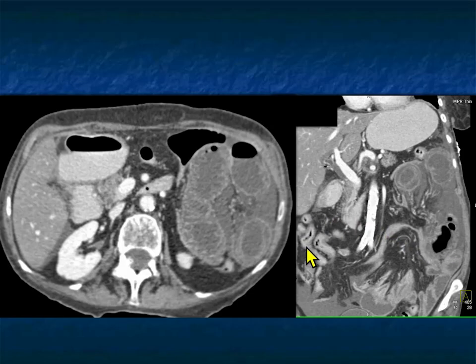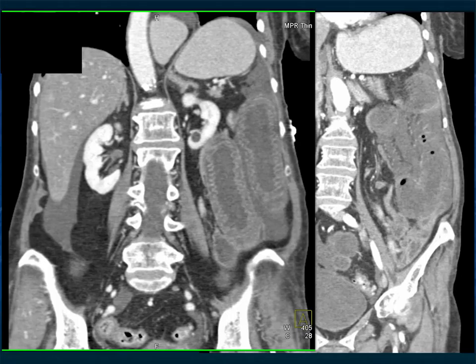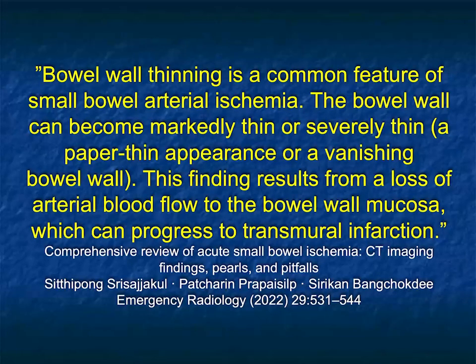Look how nice the distal small bowel loops are. Look how abnormal these loops are. It's mass effect, it's twist, and there's decreased enhancement of bowel consistent with bowel ischemia. And here's a few more images from that case. Just a beautiful example of the twist with a midgut volvulus, very nicely shown. We see midgut volvuluses occasionally, again, acute abdominal pain, but these are surgical emergencies.